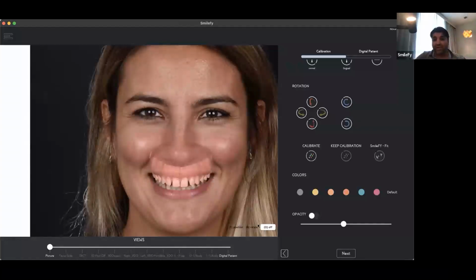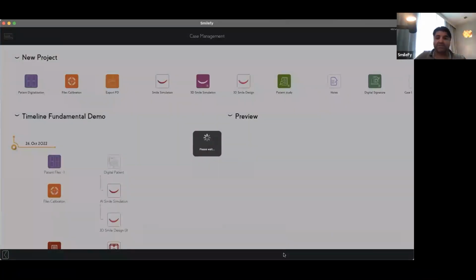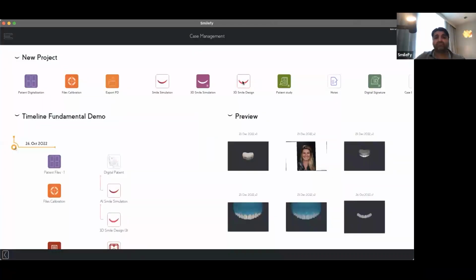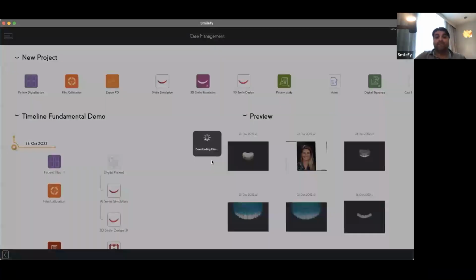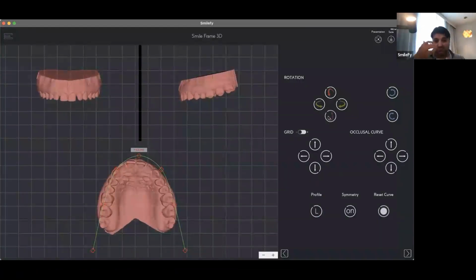Picture, intraoral scan. If we have the CBCT bone, then we have the CBCT bone. If we have the facial scan, then we have the facial scan. We can add more and more files to our digital patient. Now, let's create an in-office mockup, and give the patient a very, very special way to feel the new smile, the advantage of the new smile.